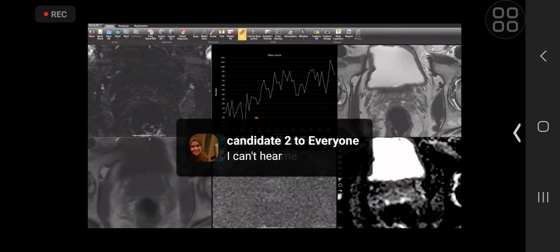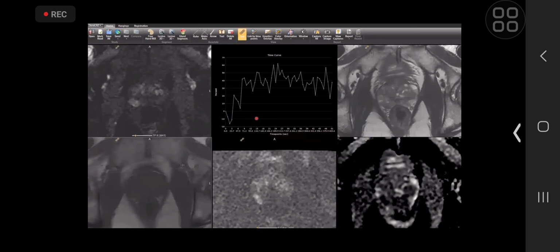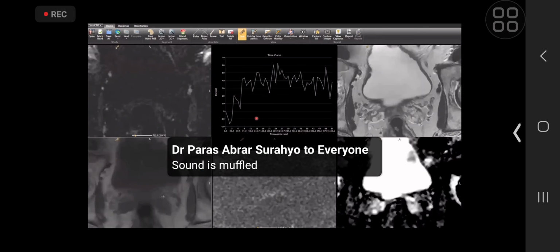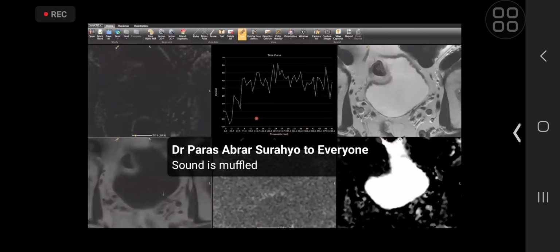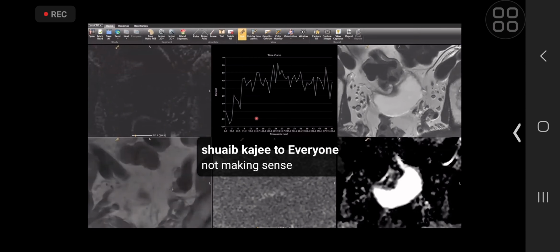How I approach this, I would go through the T1 weighted imaging first in isolation to assess for any hemorrhage in the gland. And also this sequence continues up to the bifurcation. We're looking for any nodes within the pelvis that are enlarged and any focal lesions within the bony pelvis.